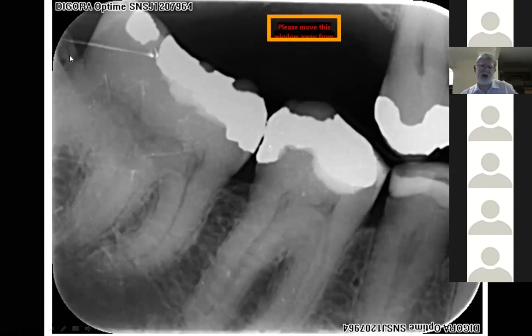Something like this, I have seen this only once in 40 years now, close on 40 years. What do you see? So a lot of the answers we're getting are fusion of 4, 7, 4, 8. Fantastic, fantastic. I've only seen that once in my career, so it's that rare.